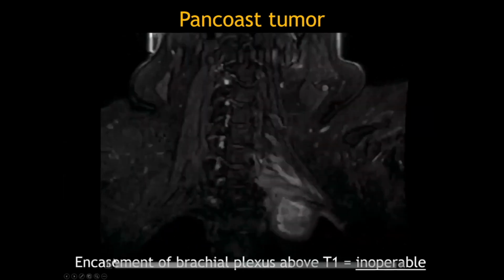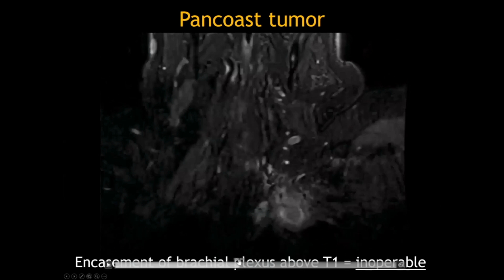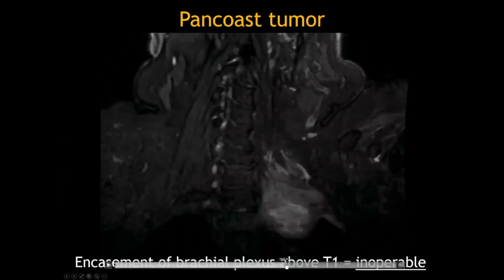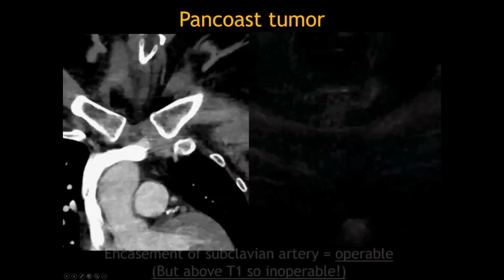Here's an example of an unresectable lesion, fluid-sensitive sequence. You can see that this tumor is basically encircling the subclavian artery and goes above the T1 level. So here's the first rib on the other side. You can see that there's tumor infiltration above that T1 level, making this unresectable.